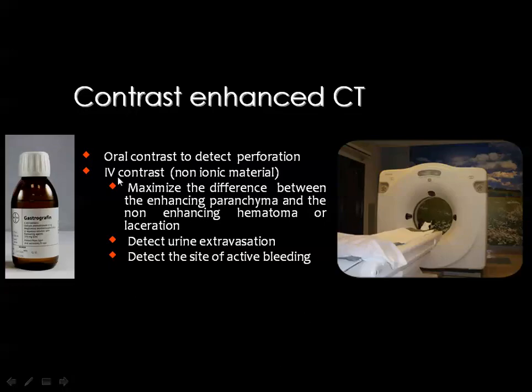While intravenous contrast is mandatory, even if the patient, of course, is not fasting, and you should give an intravenous contrast to maximize the difference between the enhancing parenchyma of the liver and spleen, for example, and the kidney, and the non-enhancing hematoma or laceration, as you can see just in a moment.